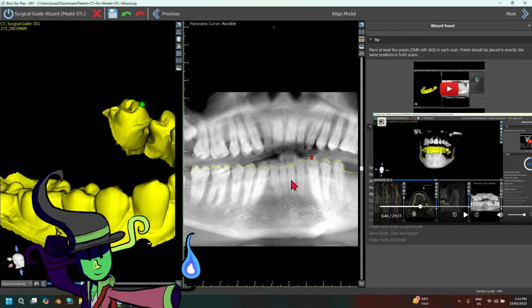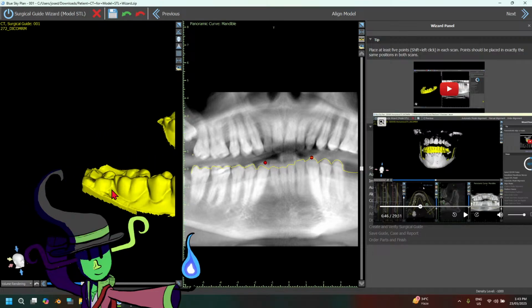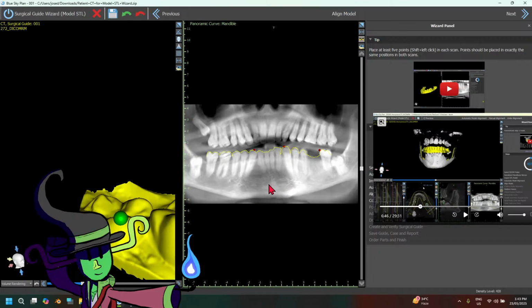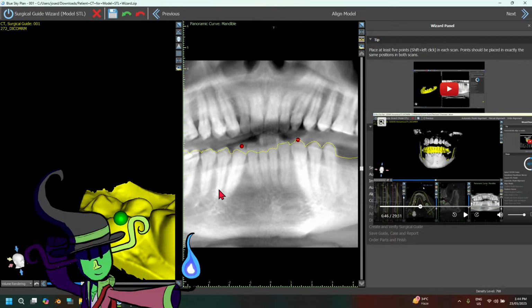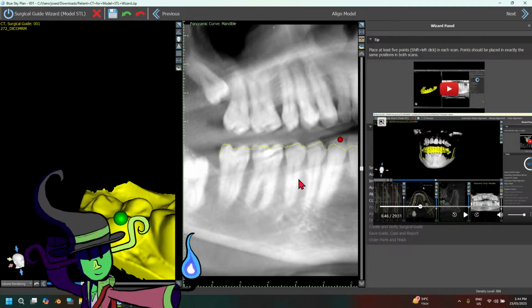So place this here. Place this right here. And let's place one more over to this side. Okay. And then I keep messing it up. Okay. There we go. Okay, right click and drag, then middle click, move.